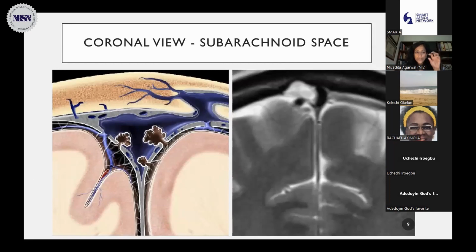This is an image which is really, really interesting, and it describes very well the concept of neurofluids. It's a coronal drawing on your left here. And this is a T2 coronal image, nothing fancy. It's a 1.5 Tesla image, 4 millimeter thick. So you're not looking at anything that you would not be able to see in your scanners. It's pretty easy. And what you're seeing here is basically this.